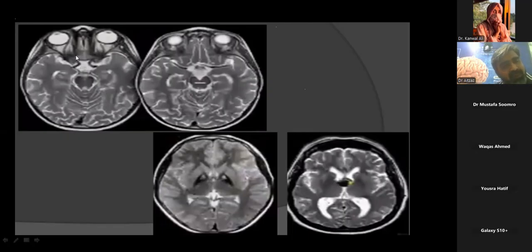Any good student who can tell the neurosurgeon about the Sylvian fissure, the circle of Willis. This is the beautiful picture of the circle of Willis. You can see, look here. This is the internal carotid artery. Then anterior one, anterior cerebral artery. ACA. MCA.